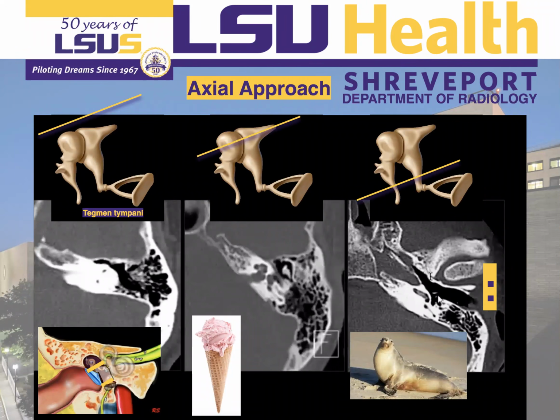If you go a little bit lower, sometimes you don't see this perfect image, but you gotta look for these two dots here. Okay? That is the handle of the malleus right here, anterior, and the long process of the incus right here, posterior. And you always have to look for the paws of this animal that looks like a sea lion. Okay, so the landmarks are the ice cream cone, the sea lion, and the two dots.